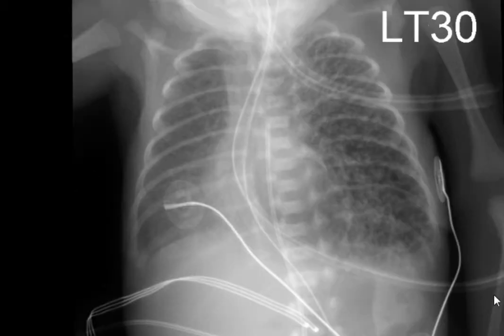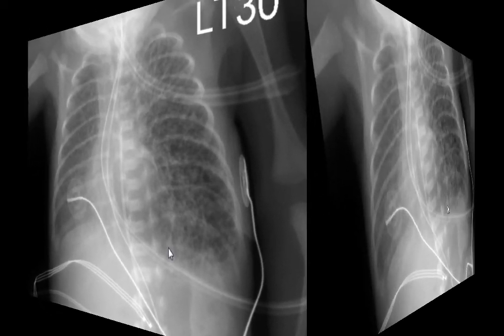This is that same patient the very next day, and you can see there's been dramatic progression of the degree of interstitial air, more tension with the diaphragm basically inverted, and a large focal collection of interstitial emphysema in the medial portion of the left lower lobe. It almost looks like a pneumopericardium, but it's not because he did survive this episode.